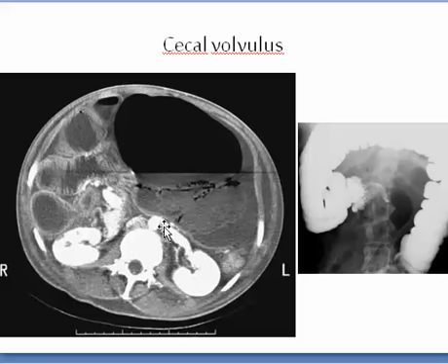As we said, cecal volvulus can present as elevation of the cecum with incomplete filling, and here is the distended fluid-filled cecum, which is not seen here because it does not fill with barium. It is filling this area, it is pushing this up. This is a cecal volvulus.